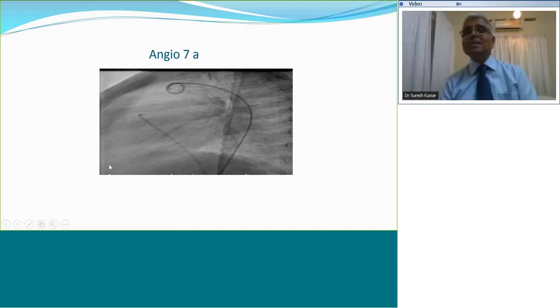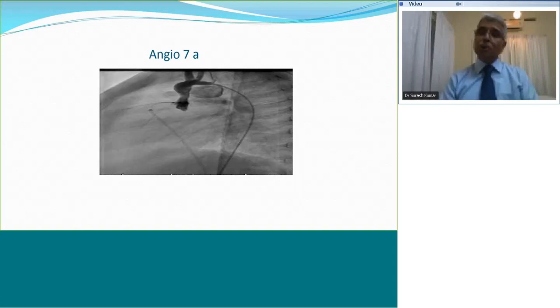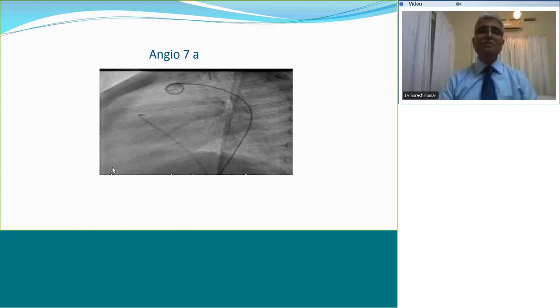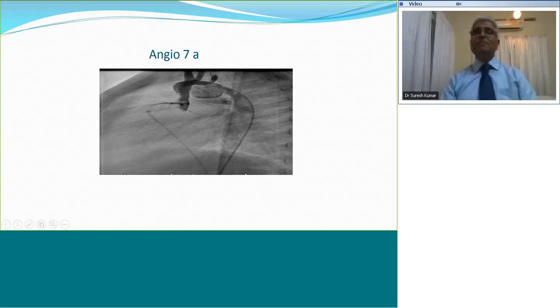I want you to describe the aortogram. Don't tell me anything else. Just describe that aortogram. Anybody? Try not to see the PA injection now. Describe the aortogram. In fact, I can try to freeze it for you. There you go. You have mainly the aortogram on the screen.